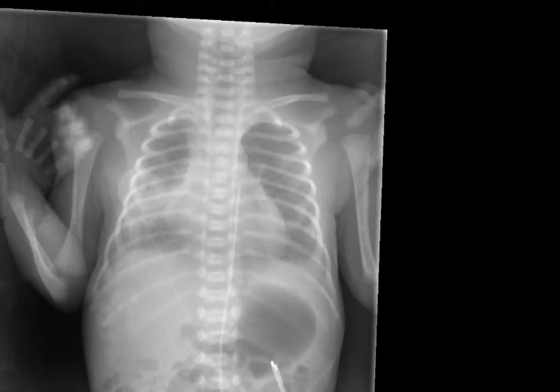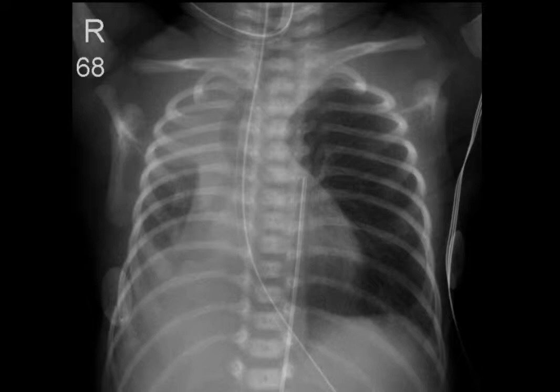Another patient with a focal area of increased density at the right base, and it is obscuring the right heart border. This is probably mild atelectasis in the right middle lobe. This is the same patient the very next day, and now you can see his right middle lobe is probably re-expanded. You can see the right heart border, and now he's got complete collapse of the right upper lobe, as well as the right lower lobe with loss of the right hemidiaphragm.